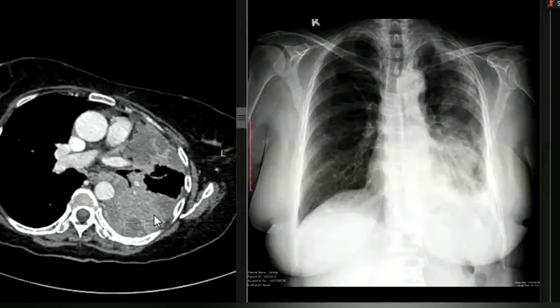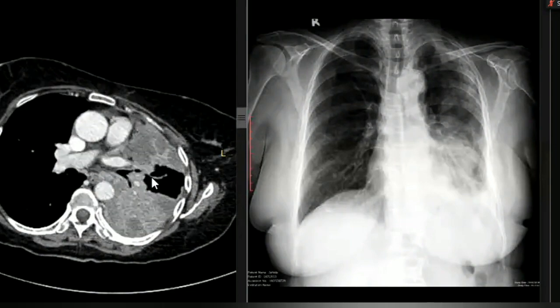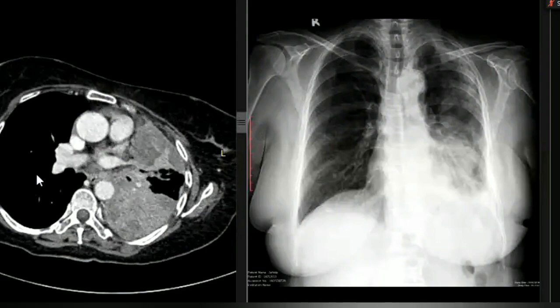And also, you will always give descriptors about the resectability of the mass, because that's what the surgeons and the pulmonologists would like to know: if they do a pneumonectomy on the left side or a partial pneumonectomy, is there a chance? That's what they would like to assess during the exam, and whether you have seen the right lung or not, because even if this area were smaller, with mets on the right side the stage would go sky high, so a surgical option won't be there.